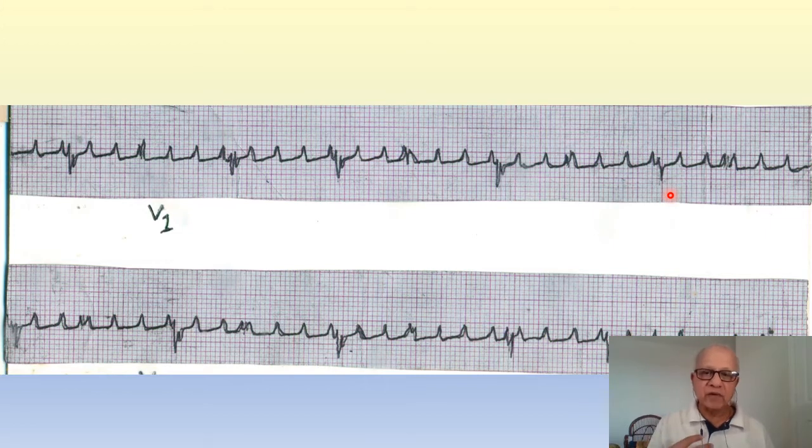That is the reason why the patient... Do you feel the pulsations of the atria? No, you don't feel it. Clinically, can you see the pulsations of the atria? That is a question you should ask yourself. If you are careful, you can sometimes see pulsations of the atria. That is, you can see the jugular vein pulsating at a very fast rate like this. Possibly the resident did not look at it.